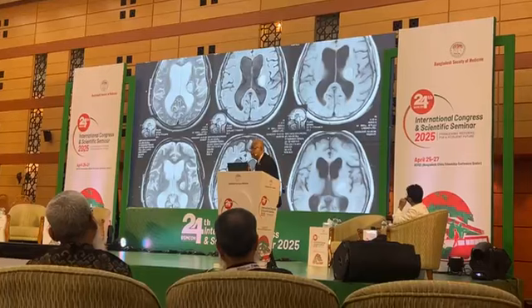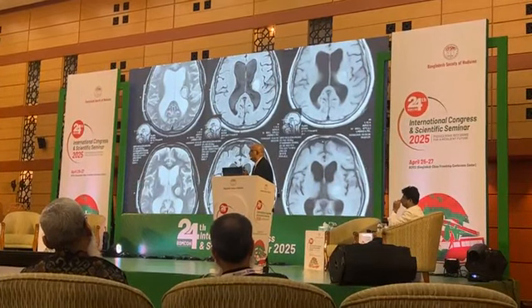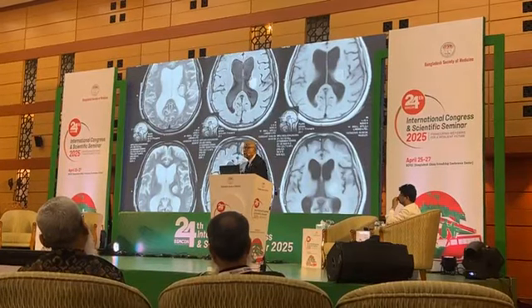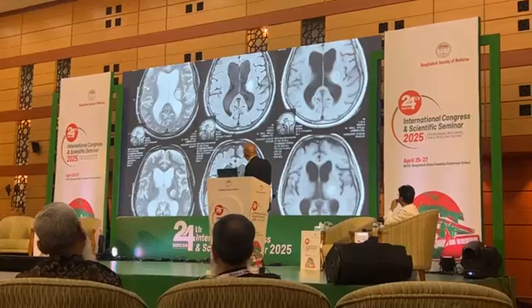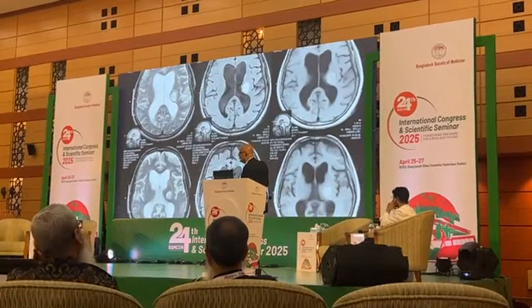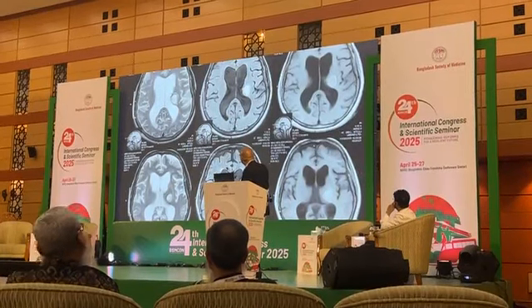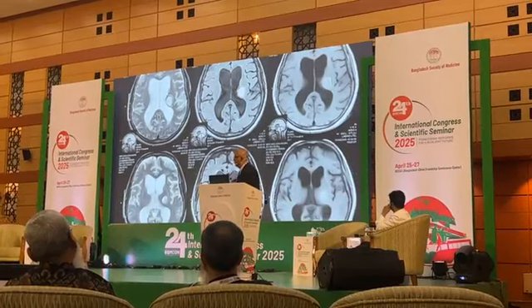We don't see normal lesions like infarct or SOLs as white in T1. We see only black in T1 weighted images. But in case of hemorrhage, we see mixture of white and black. So this is an old hemorrhage. Old because there is no pressure effect. There is not much edema there. So this is an old hemorrhage, quite a few years ago.